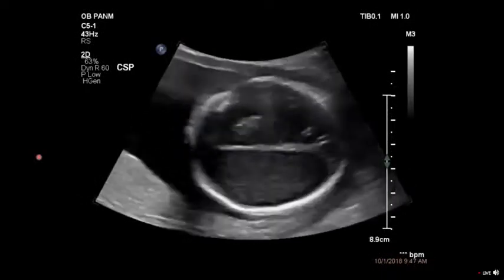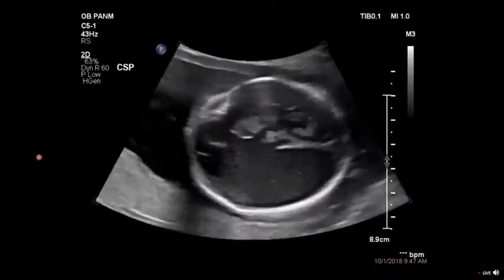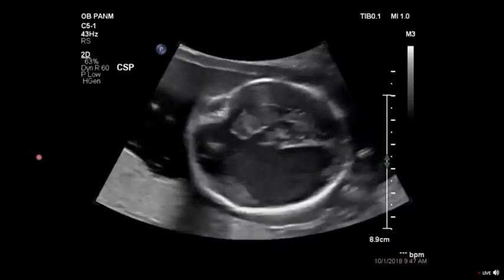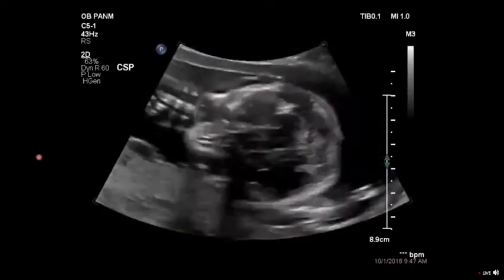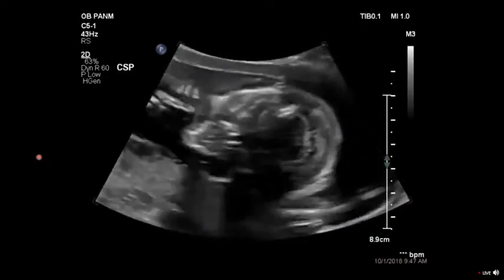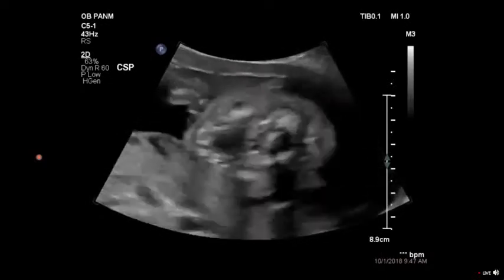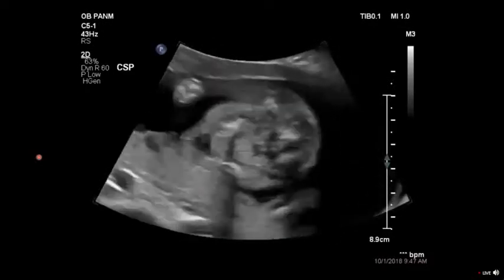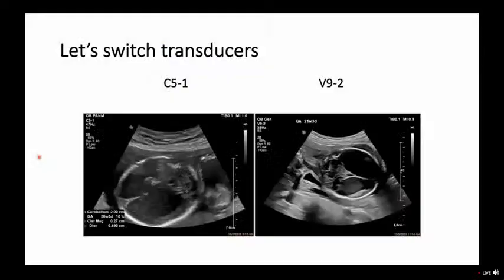What do you guys think of this? Just to scroll through top to bottom. So we're going transventricular, transthalamic, transcerebellar. Not normal, right? I can't see the choroids. There's maybe a midline separating structure. I was thinking maybe something like holoprosencephaly. The brain's a little disorganized. I'm kind of confused by the anatomy. The only thing that seems to be around is the posterior fossa.